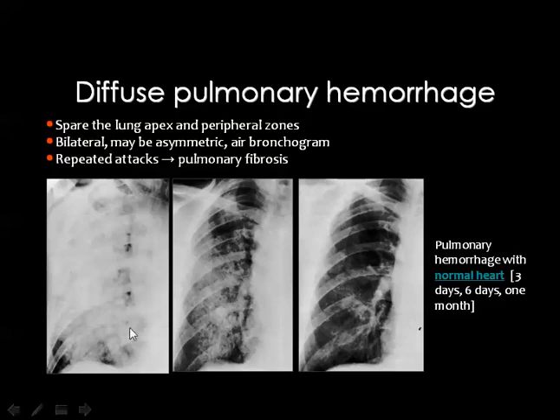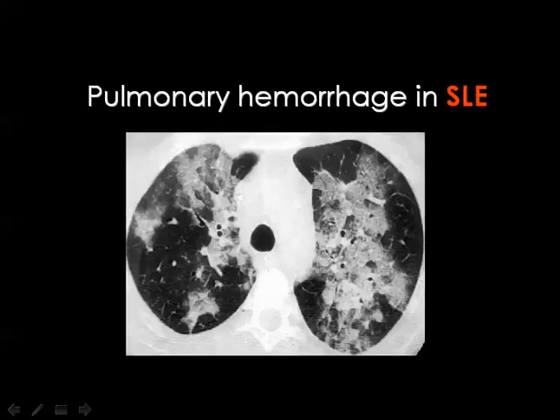Edema has clinical data that are quite evident. Hemorrhage also has clinical data that are evident, but please note that some of the patients who have pulmonary hemorrhage do not have hemoptysis. This is very important. Okay. Then, if you look here, this patient has systemic lupus, and this is one of the diseases that can cause vasculitis and bleeding. Then you see opacities in the lung.